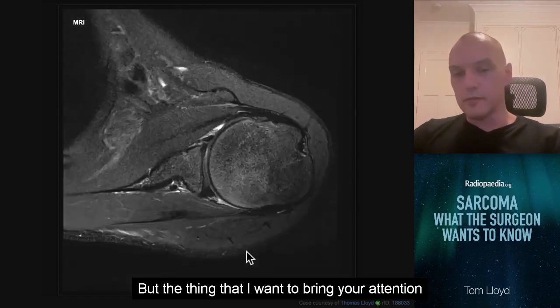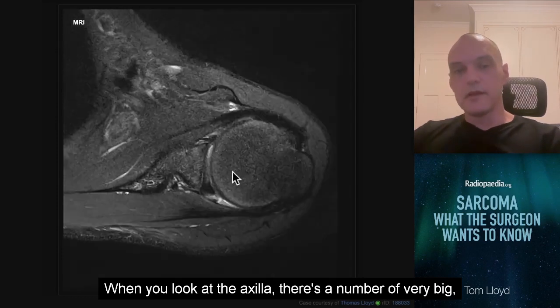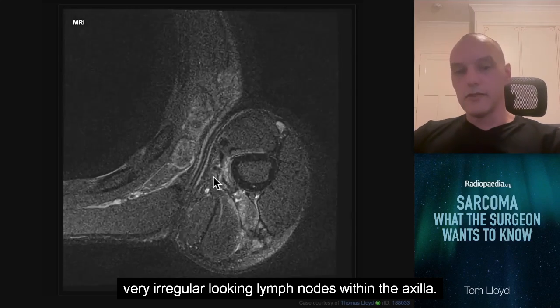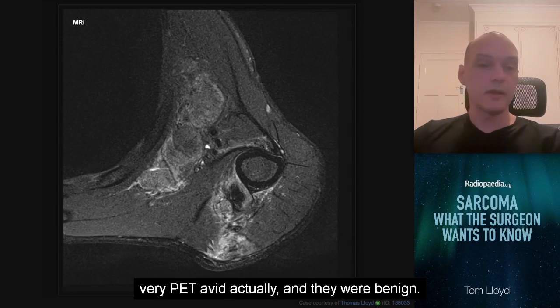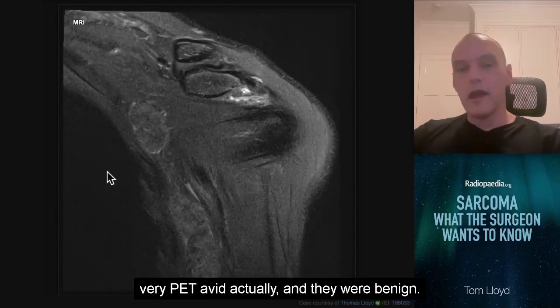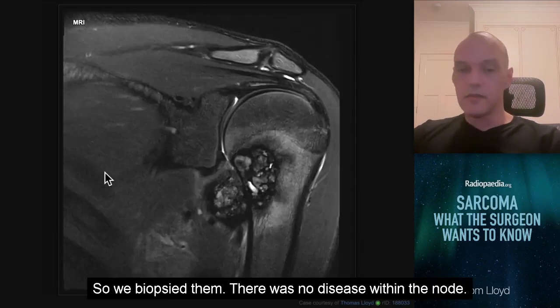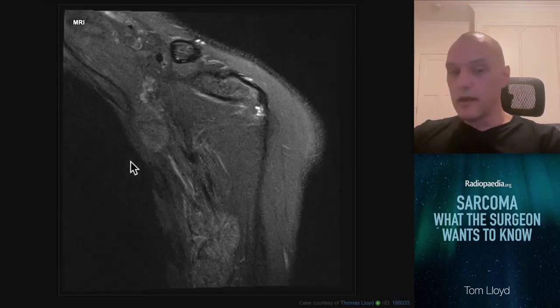But the thing that I want to bring your attention to is the lymph nodes. When you look at the axilla, there's a number of very big, very irregular looking lymph nodes within the axilla. These were all PET avid, very PET avid actually, and they were benign. So we biopsied them. There was no disease within the node. When the lesion was excised and treated, all of the nodes went away.